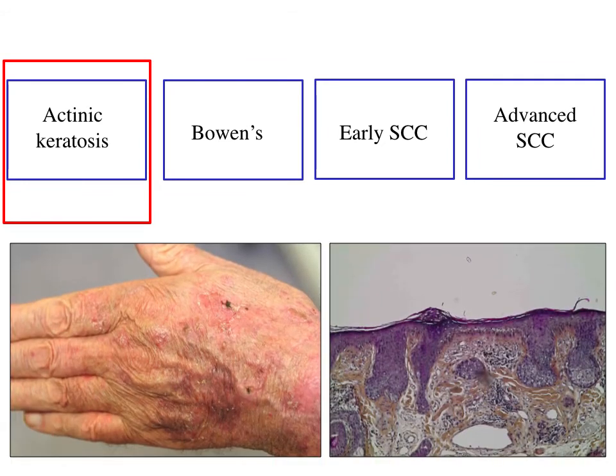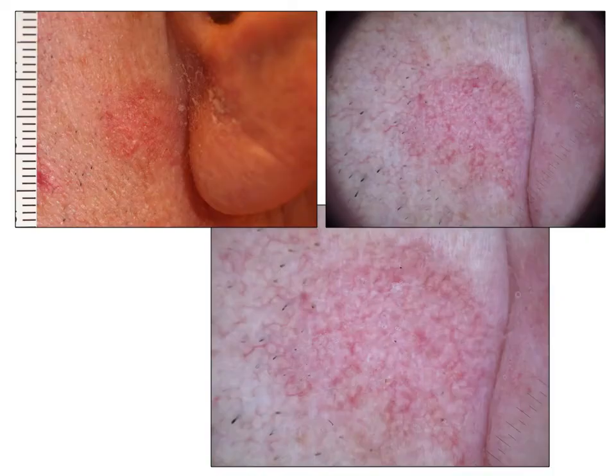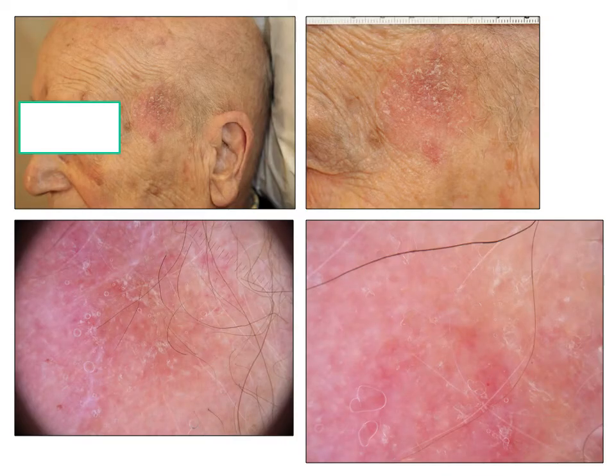In case of actinic keratosis, what we see is very little with dermoscopy, since changes are observed in the stratum corneum. So this is why we will observe this reddish change in the dermis and the follicular plugs. But again, since dermoscopy works with the reduction of the reflection of light on the stratum corneum, it's often easier to see the lesion with the naked eye than with dermoscopy.